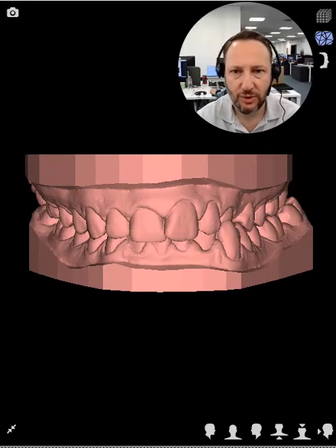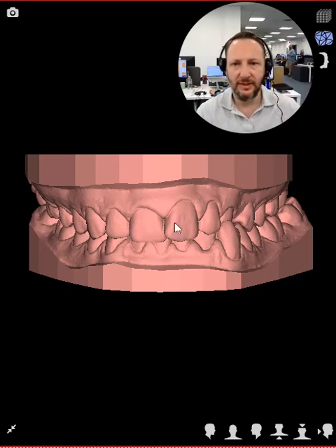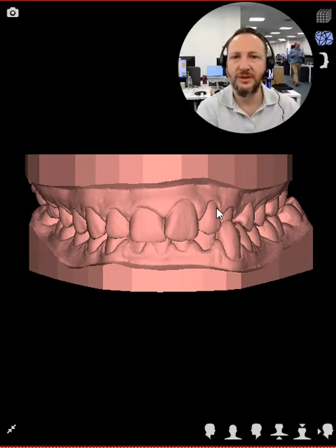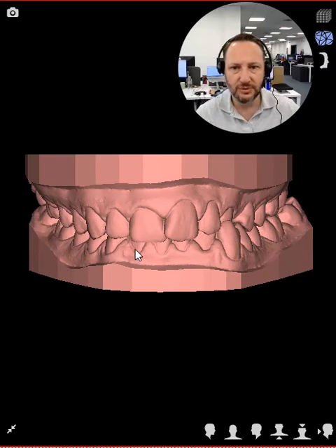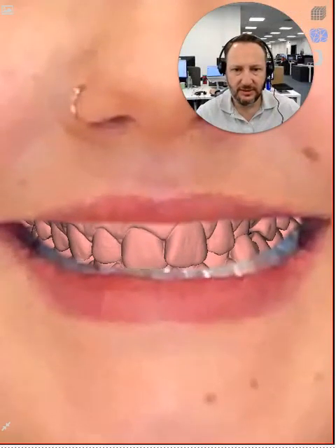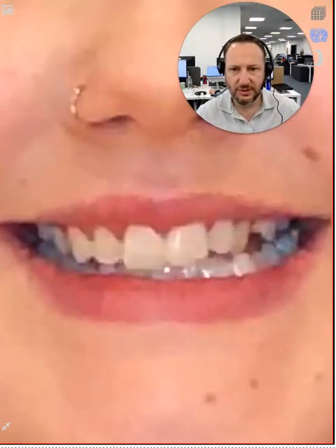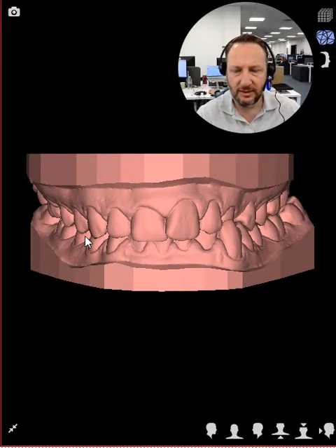We have many advantages on doing a digital smile design for your ortho cases when you are going to treat your patients with aligners. The number one advantage is the possibility that we have inside the software, before moving the case to the Clincheck or any other aligner software, to plan and simulate many options of treatments, to test drive some options. So we can have inside the software not only the STL files but of course all the photos, and we can translate these models to the patient's face. So this is a great way for us to validate everything we're going to simulate here in the patient's face.